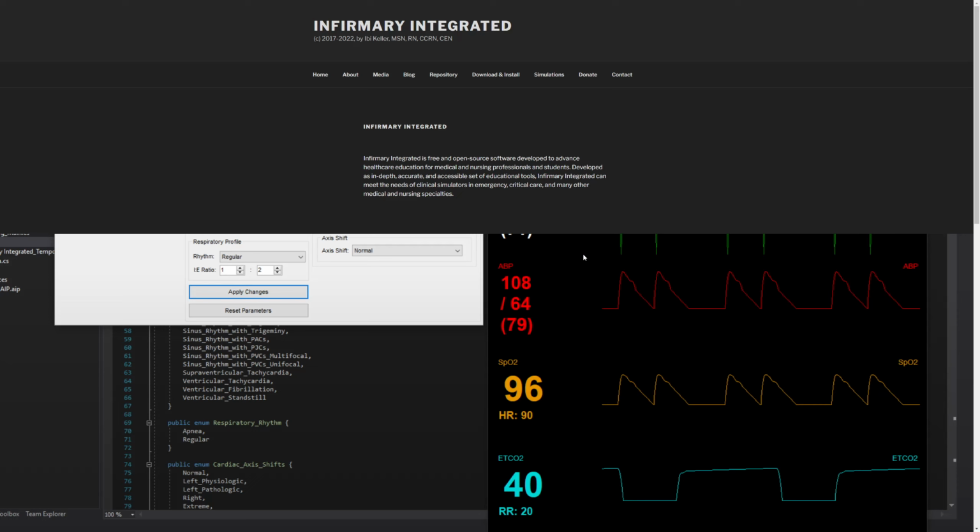I'm here to show you about the major features of Infirmary, what it can do, what its highlights are, what its usefulness is in simulating devices and simulating patient modeling, and for its use in nursing education, medical education, other healthcare education spheres.